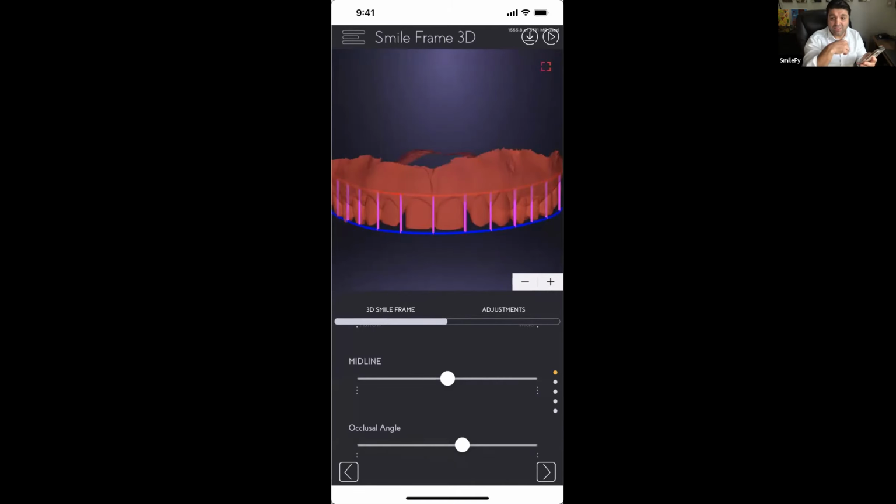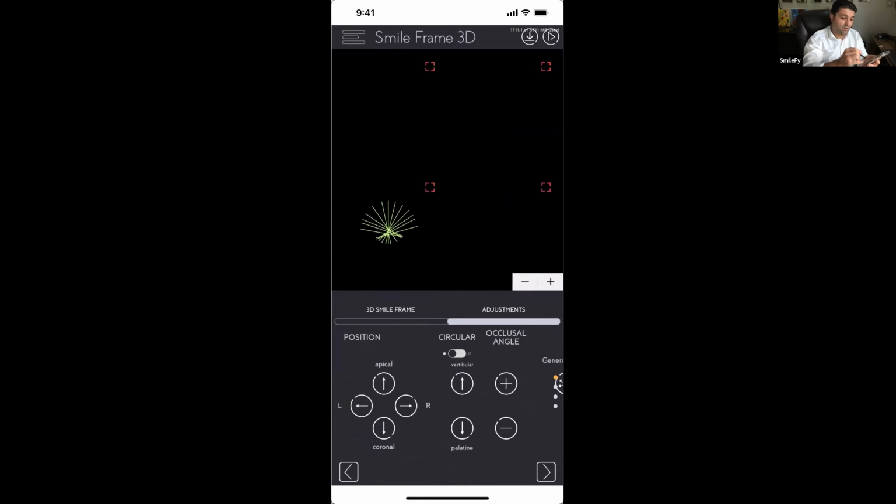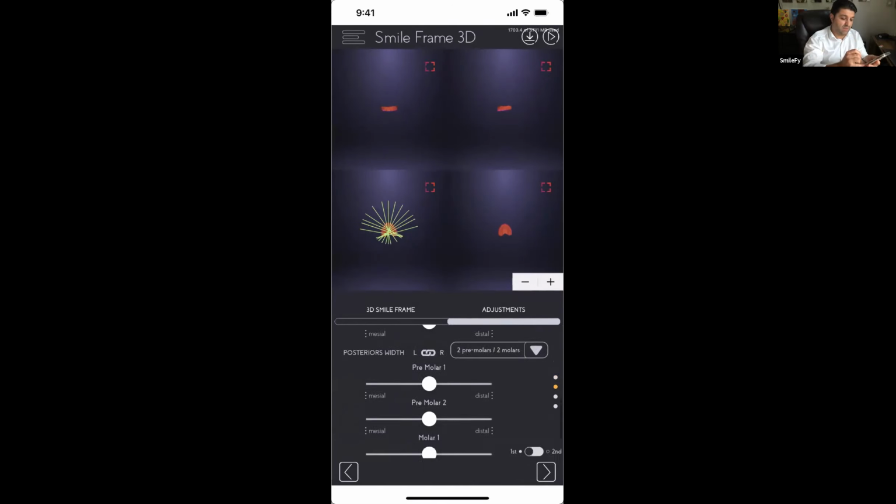As I told you yesterday, we can turn the midline, we can move and shift the midline, but the whole denture, the whole teeth that we use are just moving around the occlusal curve, right? So when I move the midline, let me see, I adjust the midline, you see everything goes in place. That's good enough for me. And let's go to the next screen.